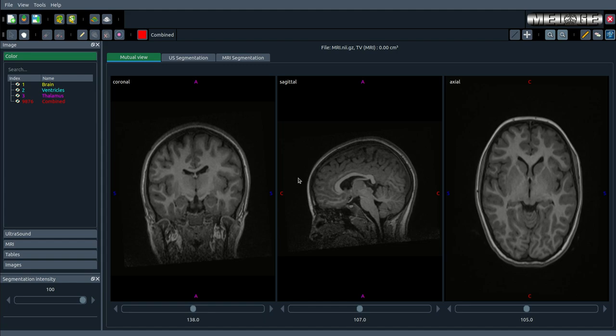Welcome to Melage. In today's tutorial, we'll explore how to load and save projects in Melage software, a fundamental skill that enhances your workflow by efficiently managing your project.